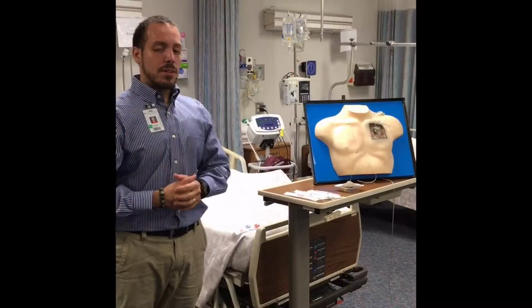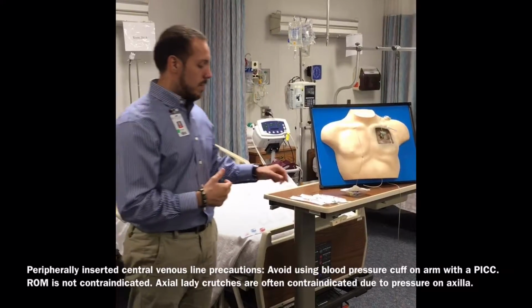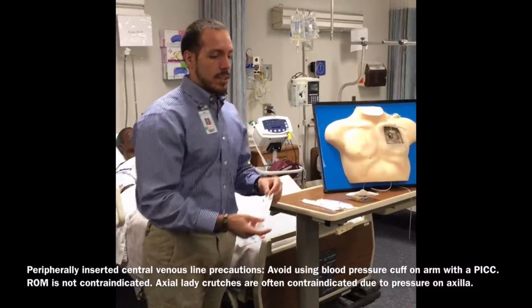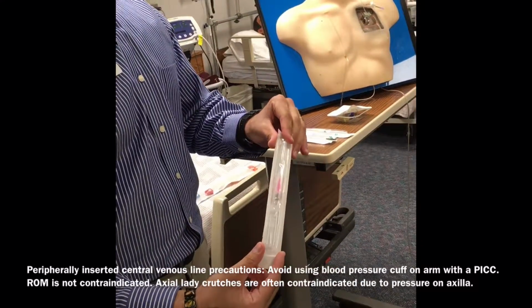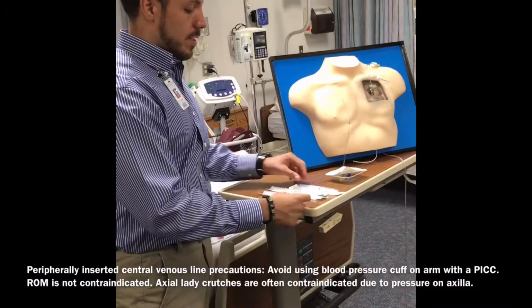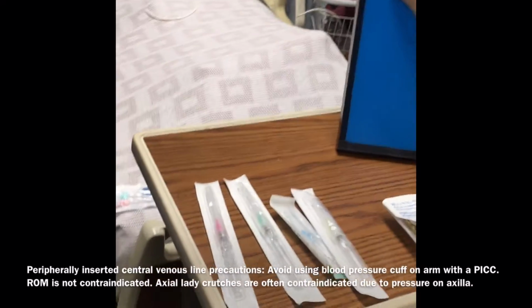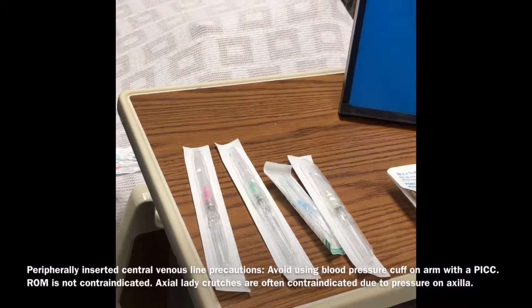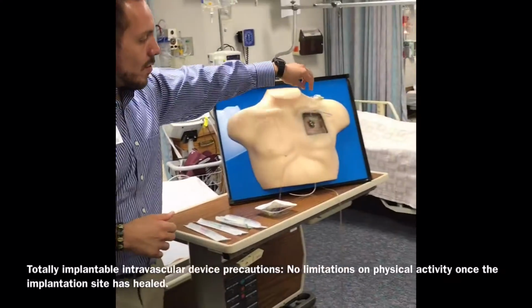Now we're going to talk about some of the catheterizations that would go with those IV lines we talked about. Right here we have the peripherally inserted central venous lines, and they have different sizes, as you can see here. Same thing as with the IV lines, you wouldn't be taking those out. Right here, we also have a port-a-cath.